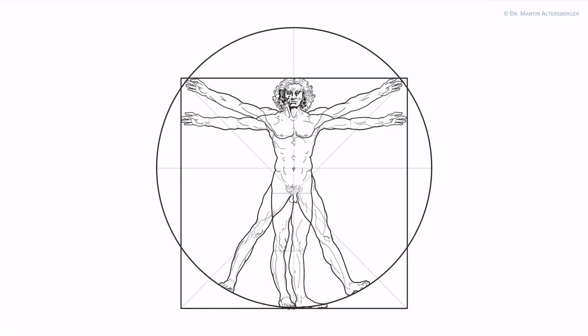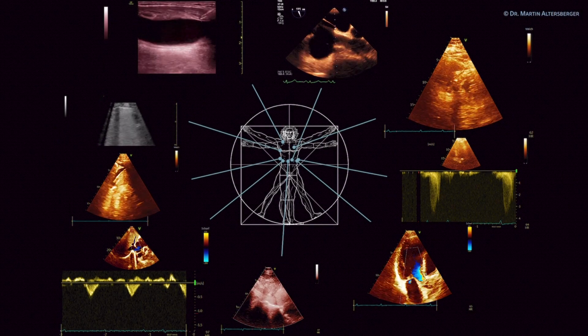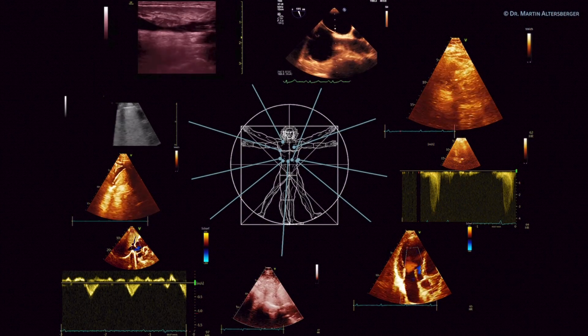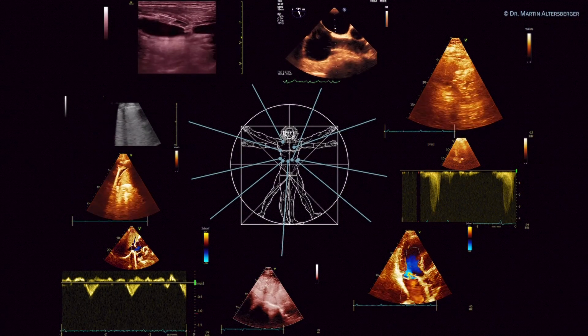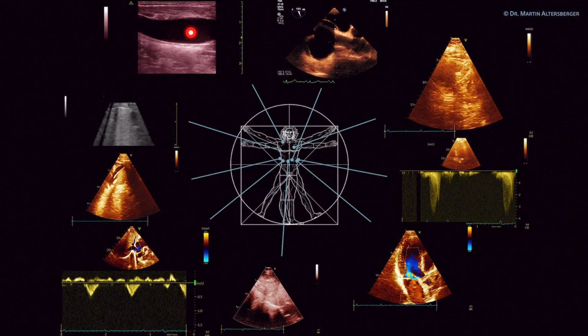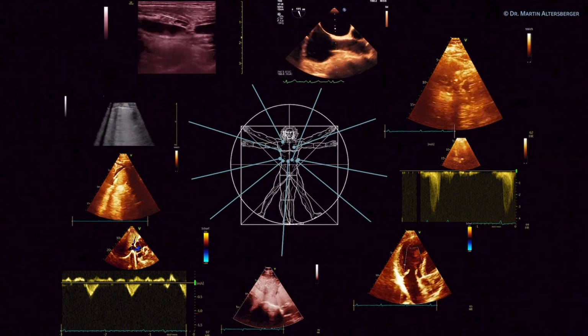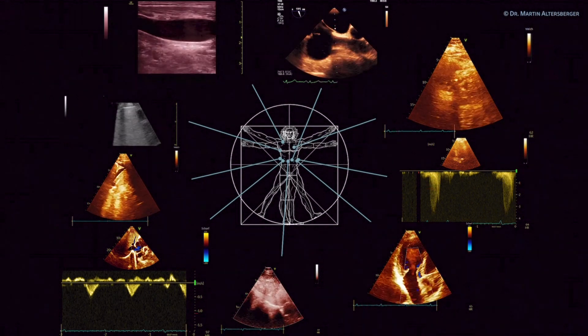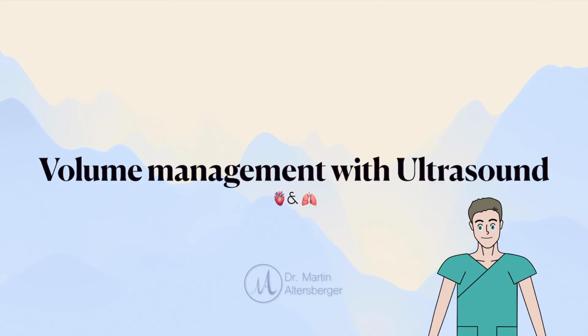What is the volume status of this patient? That is a very complicated question where ultrasound can actually help you answer this question very often. Fortunately, we can use several loops, videos, images, and imaging modalities. Here, for example, ultrasound of the jugular vein, TEE studies, TTE studies, Doppler studies, and many, many more to figure out what the volume status of our patients actually is.